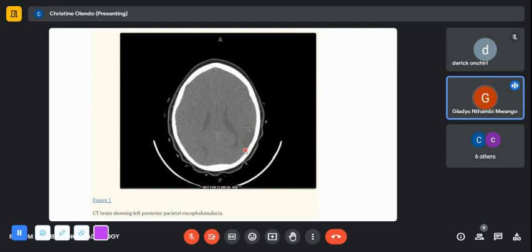If you look, the adjacent ventricle is more dilated than on the contralateral side. And that occipital horn is displaced, it's like it's pulling towards it. Yes, so there are features of volume loss. And because of those features of volume loss, no matter how subtle, that's why you now would call it encephalomalacia.